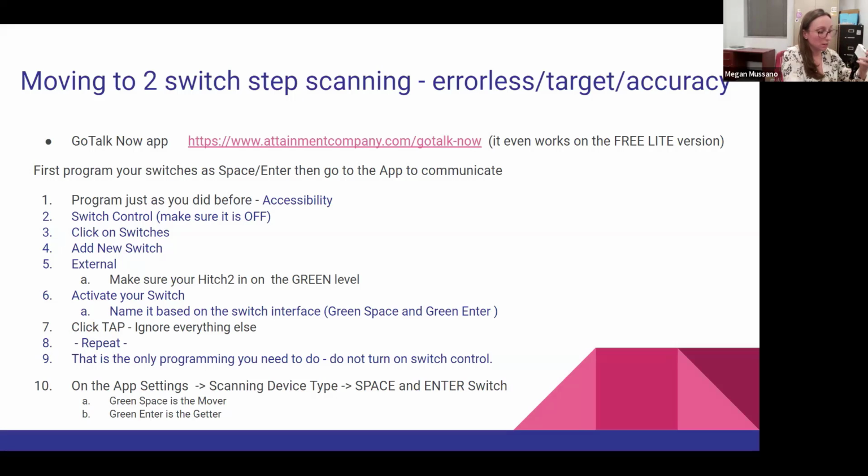This is a way to make it kind of errorless learning. You can put different, it just said 2. You can put different snack activities on, or just anything. It's truly just my small stepping stone to get students to scanning for a communication device. So here are the directions to do that.